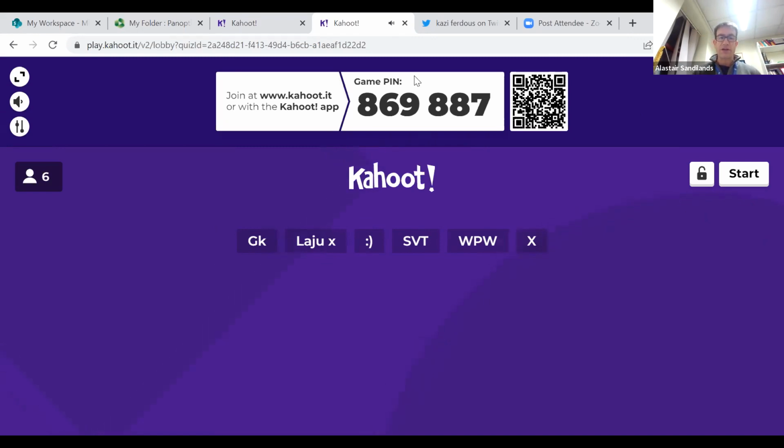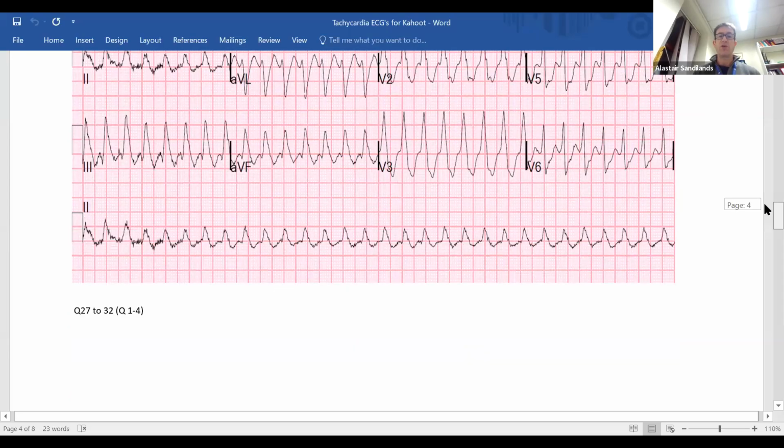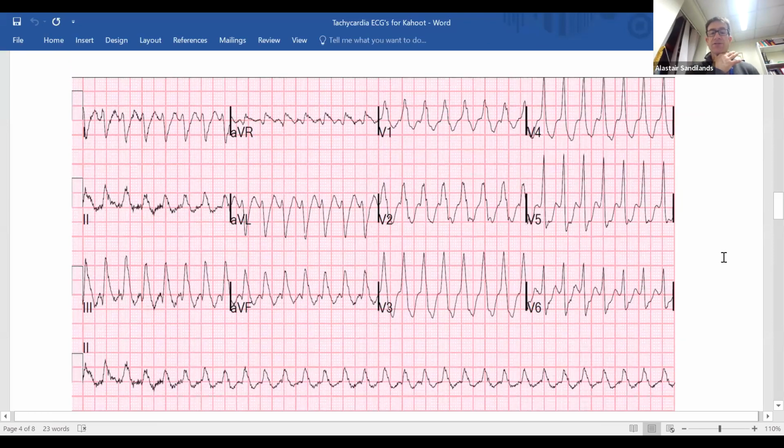I know you've got the ECG, but I've got the ECG to show you. So this is for questions 1 to 4. I'll just let you look at that ECG first, please.